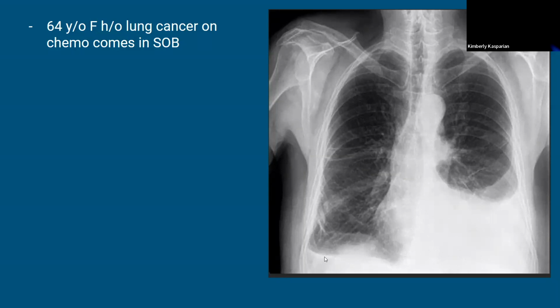I would say something where it's just blunted is small or trace. Maybe to here is small, to here is moderate, here's large. I don't know, there's nothing really perfect. The biggest takeaway on this: how do you know that this is a pleural effusion and not an infiltrate?